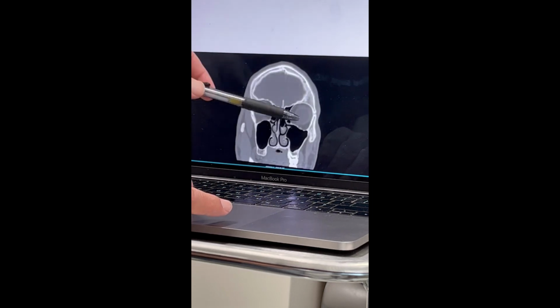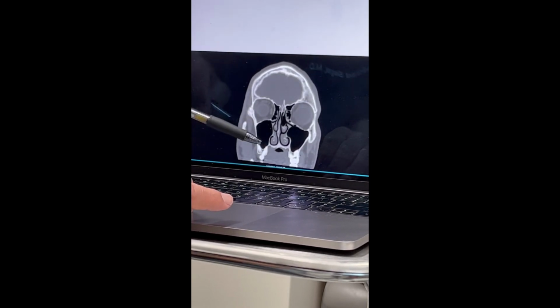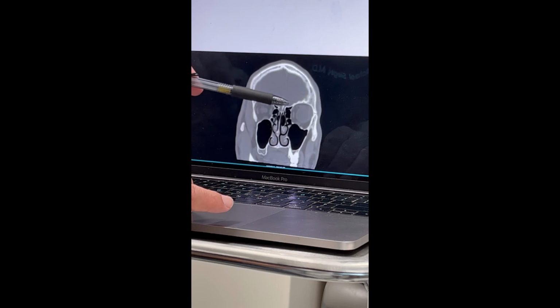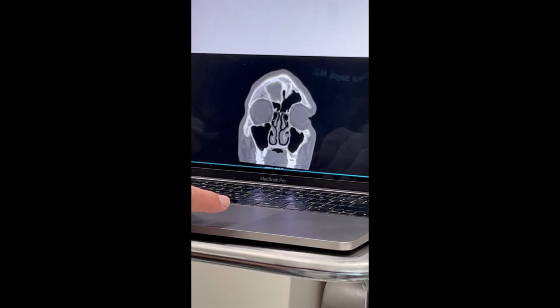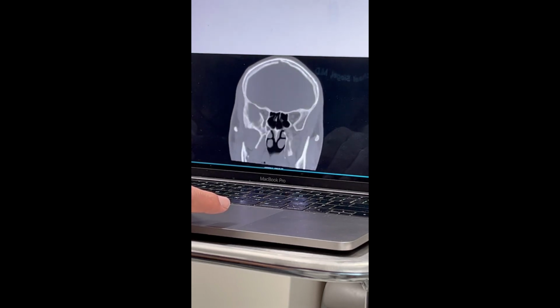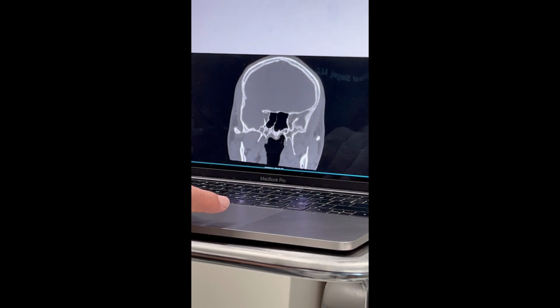Again, these are the eyes, this is the brain, this is your skull. The sinuses are just hollow spaces in the bone. So there's hollow sinuses under the eyes, between the eyes, and over the eyes. The frontal sinuses over the eyes. The ethmoid sinuses between the eyes, and the maxillary sinuses under the eyes. And if we look real far back, the sphenoid sinus is in the back of the head, middle of the head, and behind the eyes.